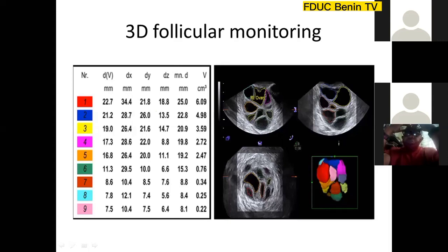But when you do a 3D, and it gives you this type of reconstruction, all these are follicles where the ultrasound automatically takes different diameters and gives you the average. And studies have shown that when you use 3D to measure your follicle, and you have follicular measurement of about 14 millimeters and above, about 60% of them contain mature oocyte. So it is something worth having.